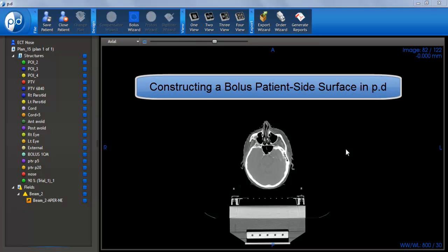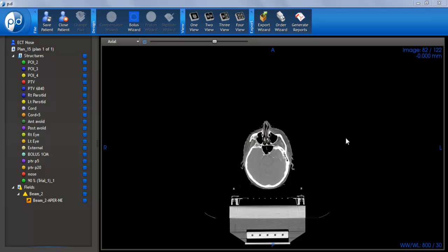Welcome to our video on bolus patient side surface design using P.D. So as you can see, I have P.D open. I have my ECT nose case provided by .decimal loaded into the software.